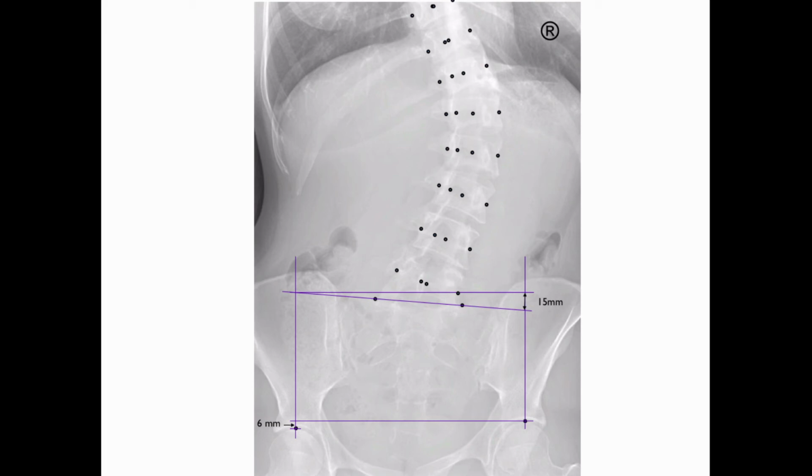Okay, now for the most important part, which is actually finding the center of mass. You're simply going to find the midpoint between the spinous process and the center of each vertebrae. Okay, so that'll be represented by these little small red dots. And we'll start down at L5, L4, L3, L2, L1, T12, T11, and T10.